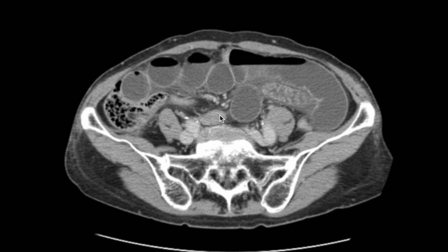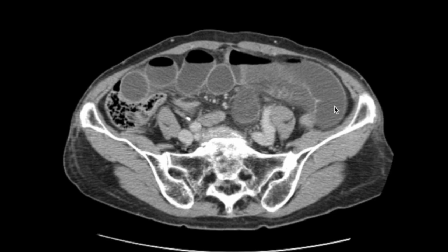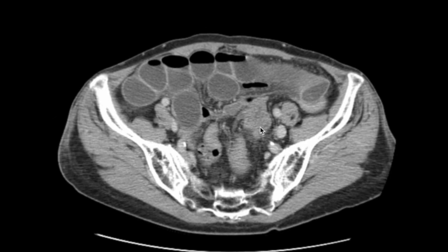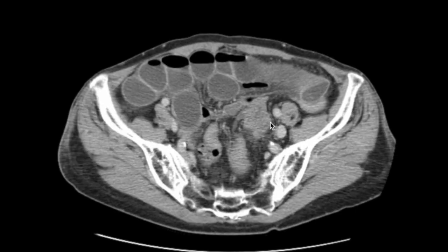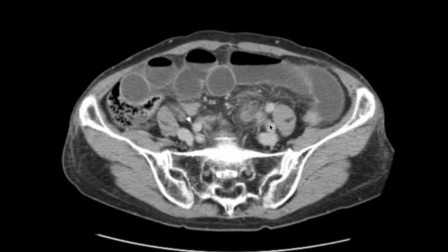Let's start around this area where the niveau is prominent and track toward the right. Then, what do we find? Here, the small intestine's dilation ends abruptly, and it suddenly becomes narrow. That means this is the transition point where obstruction occurs.